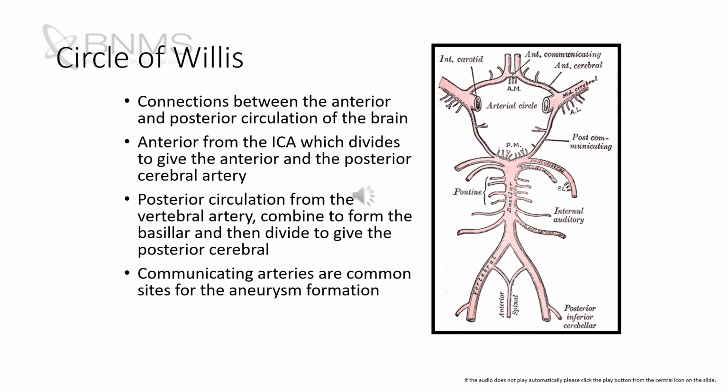Smaller posterior divisions of the internal carotid artery project posteriorly within the suprasellar cistern. These will form the posterior communicating arteries and connect to the posterior circulation.